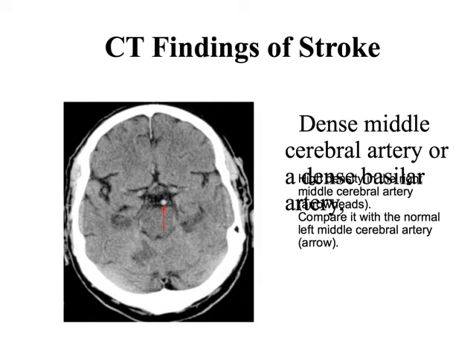So, apologies for this slide. But what it's basically pointing out is that this middle cerebral artery, the basilar artery right here, is showing up hyperdense on the images. This is a non-contrasted study, and we can compare that with a normal left middle cerebral artery.